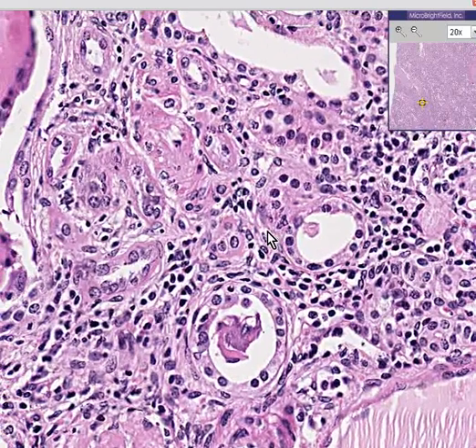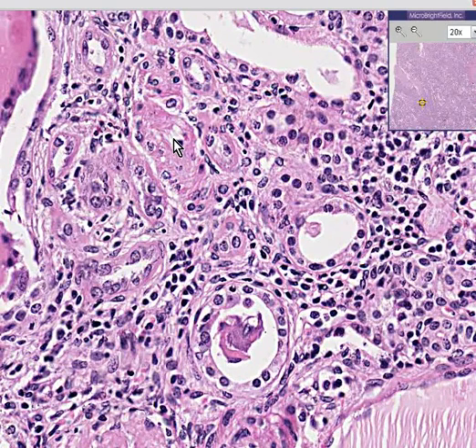And that's all that I want to say. Here's kind of another thickened vessel here, isn't there?